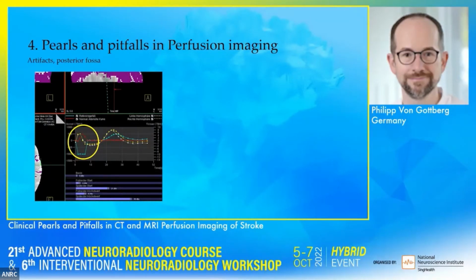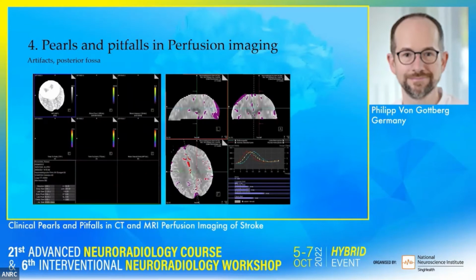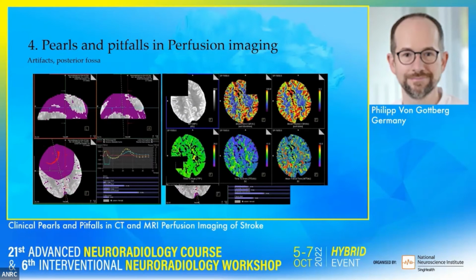if we get into this, when manually reading this data, we can just, in every software, just cut out this part, and actually if we do that, we can get quite well imaging, and this whole examination is not lost, but actually can be done, can be read very well.